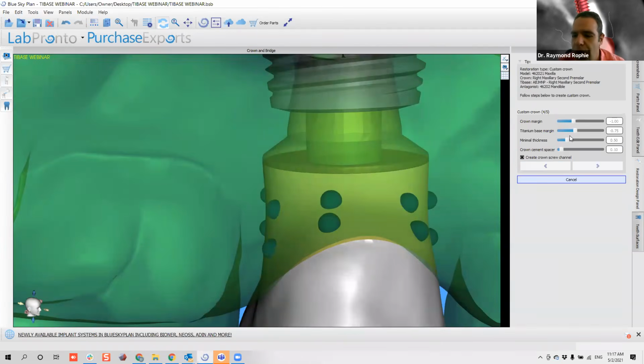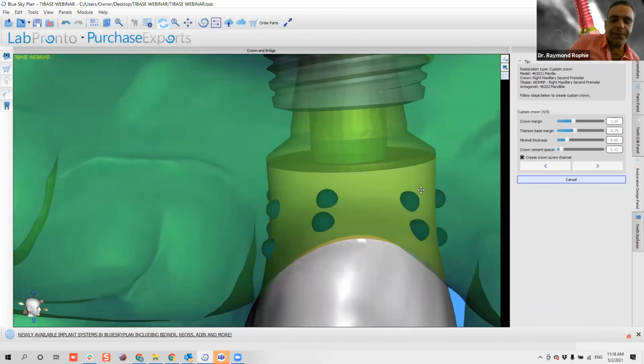Okay, good. You can do the minimum thickness as well. So for example, if you will 3D print the crown, there is a very good armamentarium of materials that with at least 0.5 or 0.4 of minimum thickness will give you very good strength or resistance in the material. I've been using the Vigo crown. It smells really good. Okay, and the Accurata printer.